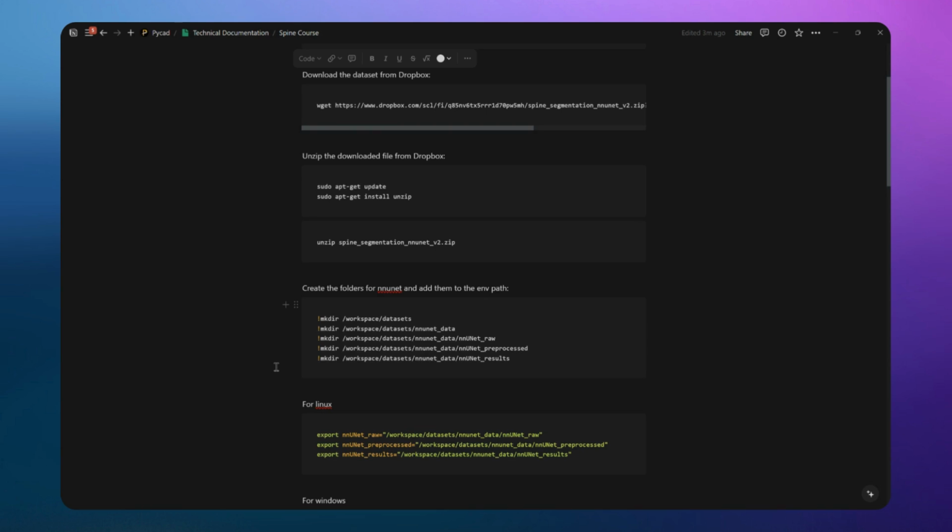The code is open source and you can modify it as you want. But to follow the course and to have it easier for you and for me and for everyone, we will try to just stay organized, as nnUNet is waiting for the folders and for the commands and everything like that, and also for the dataset naming. We'll come to that later, but just to show you here.